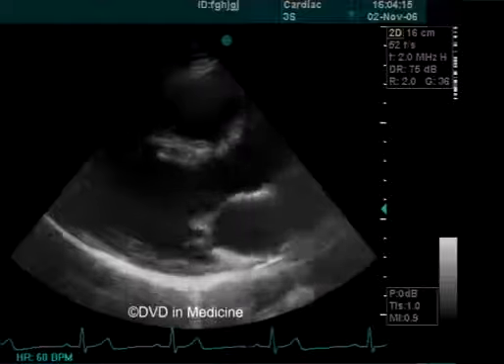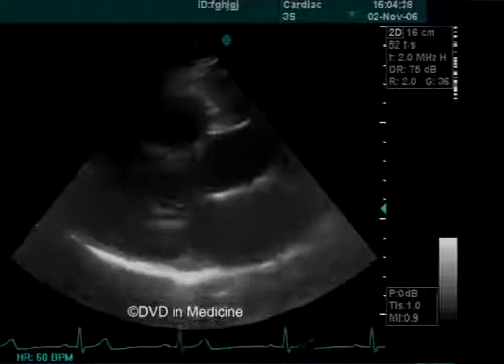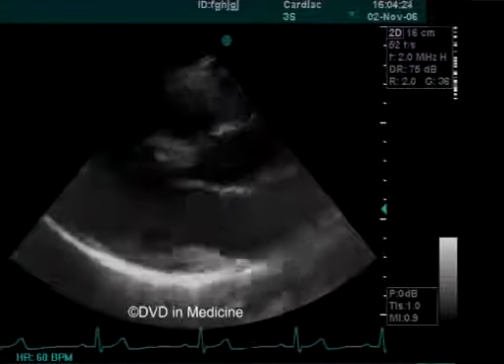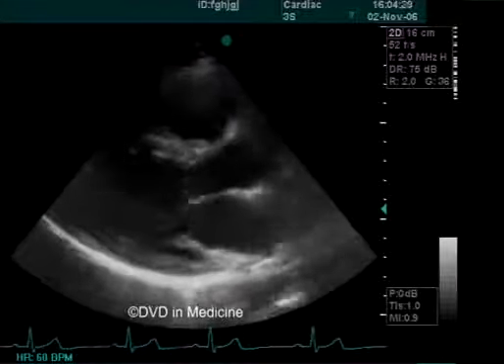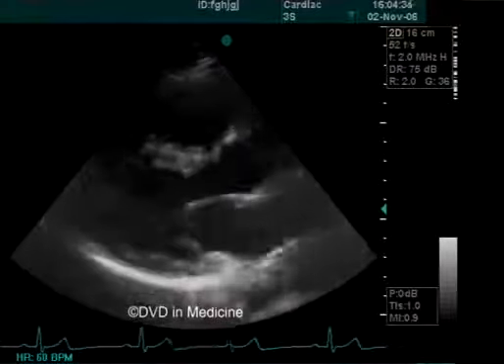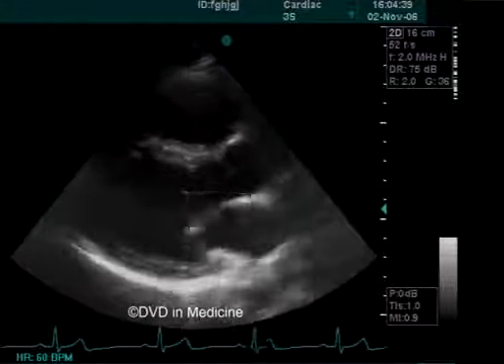Therefore, in summary, the parasternal long axis view is the main view, and one must start cardiac ultrasonic evaluation here. This view is also the starting point for obtaining other two-dimensional echocardiograms. The parasternal long axis view gives one the possibility: 1. To diagnose aortic root pathology, dilation, dissection, atherosclerosis of the aorta.